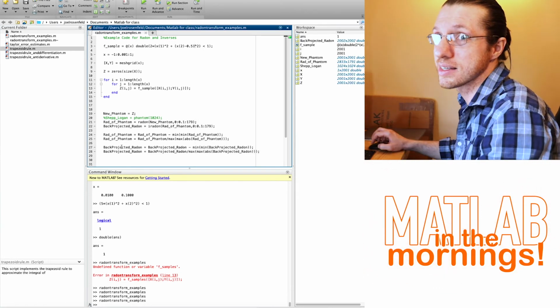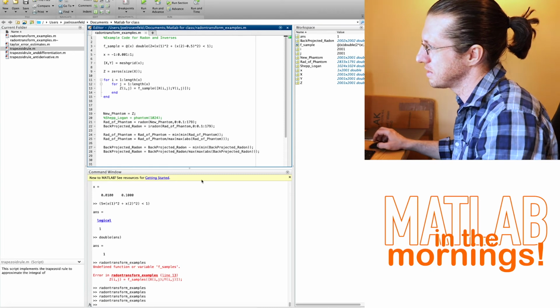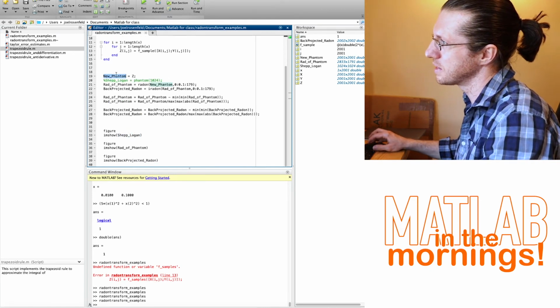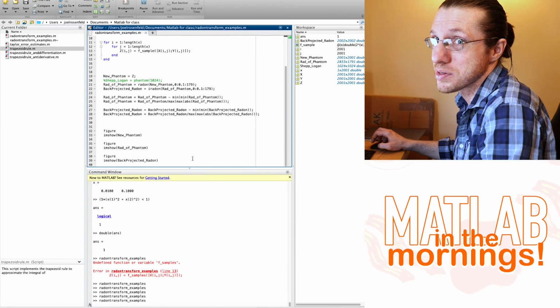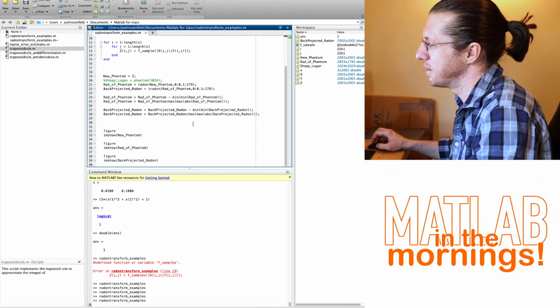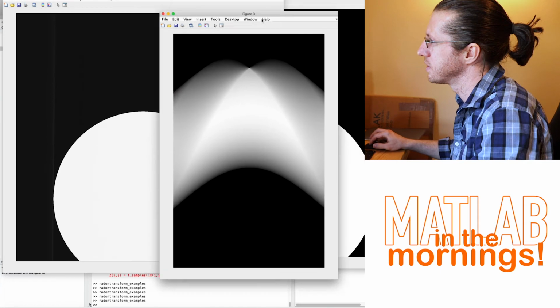Here's a trick: that circle we keep showing is actually a filtered transform. If I change this from Shepp-Logan to, say, new phantom, we actually get a comparison to how the inverse radon transform is performing. Pretty good, honestly. Give it a second. There we go. Okay, so here we go.